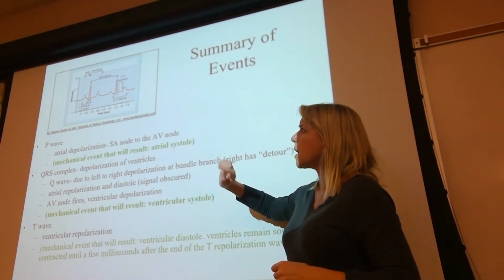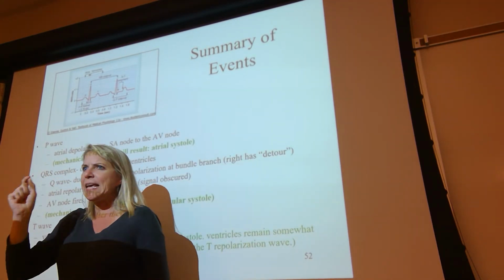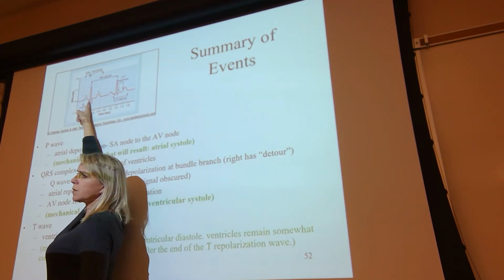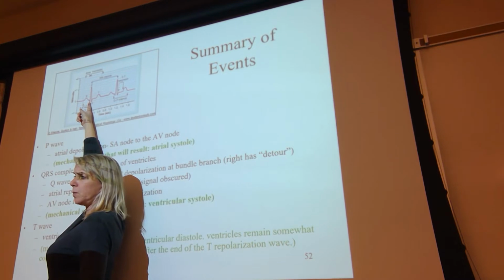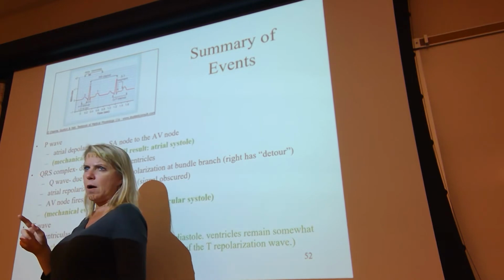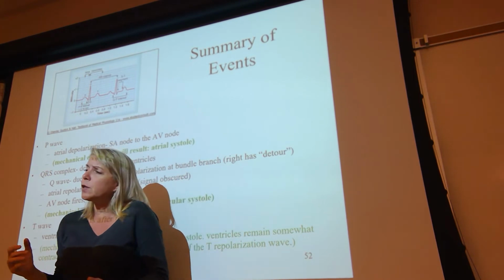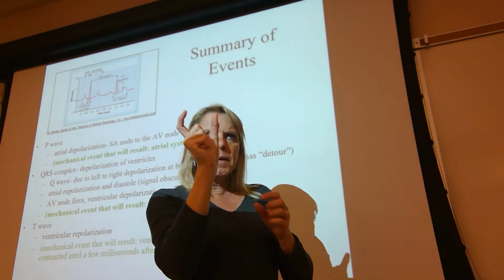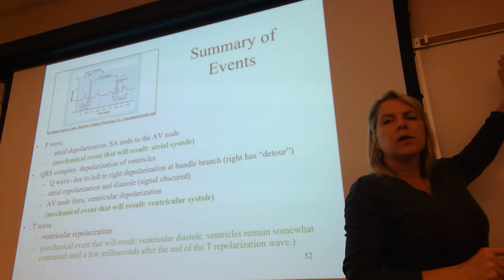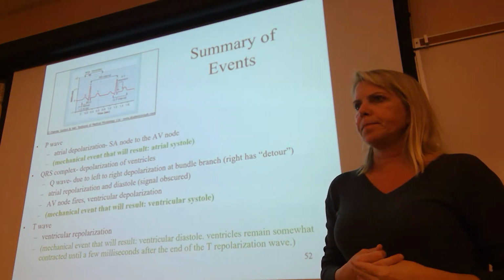What about the QRS complex? If you were measuring that, you would start from the Q, if it's there in your patient. Because we talked on Tuesday that some people don't have a Q wave, then you would mark at the beginning where the pen starts to go up for the R. And you would finish at the S. And again, you would plug that millimeters in length into the change in distance in the numerator. Your velocity is still your paper speed, and again, you would solve for time.